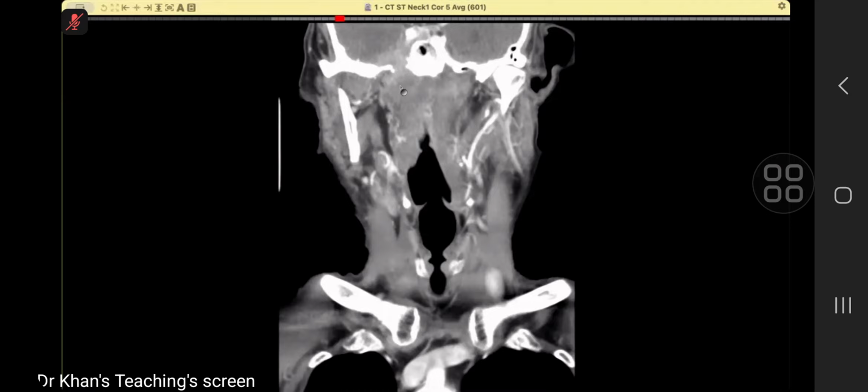But then the thought process which you have to develop is, what is the epicenter? And this is where the differential, give some words to it. You might pass if you say that this is a malignant looking lesion, but to get more marks, you have to be more elaborative. Thank you very much. Well done. So candidate 2 is done.